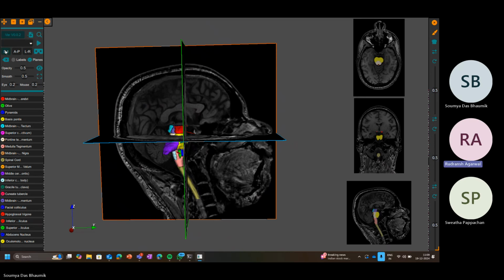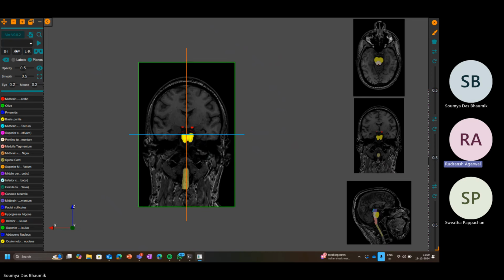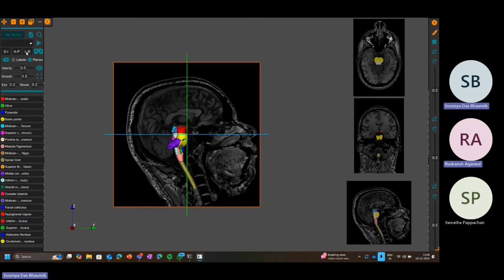Let's wait for it to complete. No, I don't think so. So you might have to load the lesson again from the file if you want to bring it back. Yeah, from the load. You just have to click it. Yeah, projections. Okay, got it.